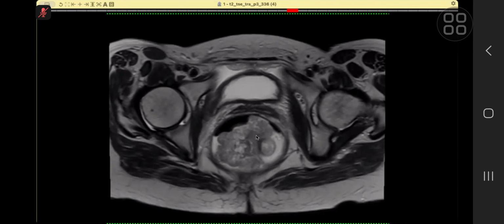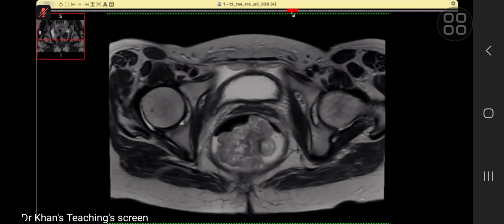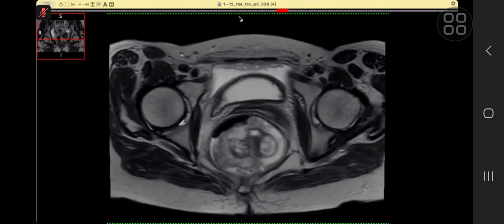On the basis of the age, the most probable diagnosis is likely a neoplastic etiology. I would inform these findings to the clinician and would refer this patient to a lower GI MDT for further discussion. The patient will probably require a biopsy for confirmation, sir. Okay, thank you.